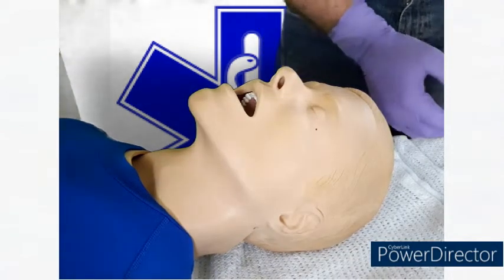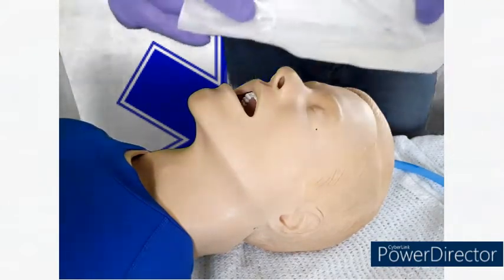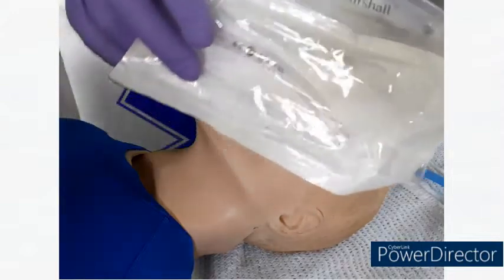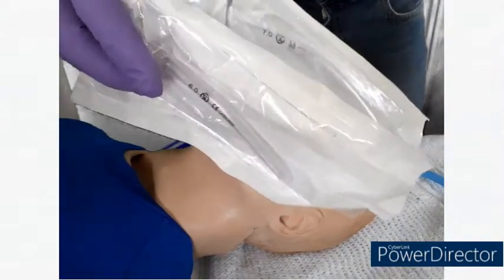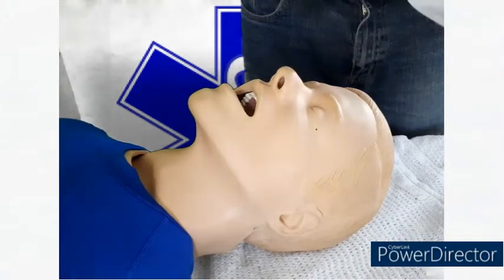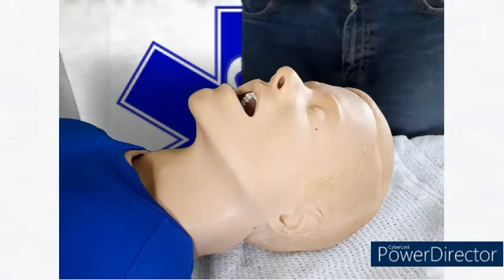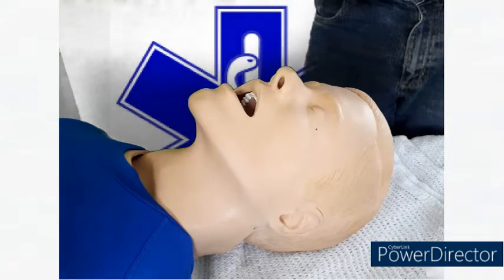The next thing I can look at then is a nasal pharyngeal. Now, nasal pharyngeals will come in a variety of sizes, 6, 7, a size 8, and again, different manufacturers, different qualities, different colours and so on, but they all have the same traditional method of using it.